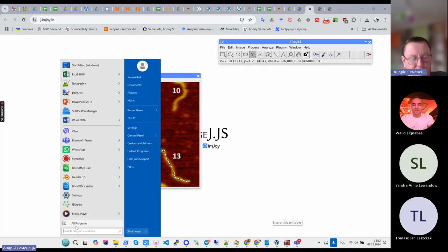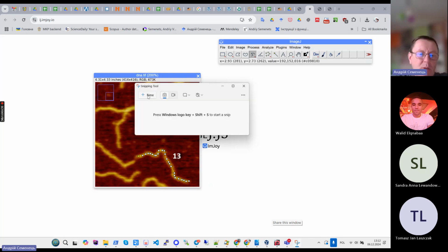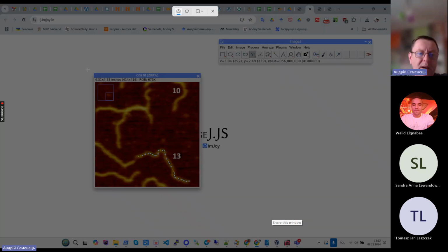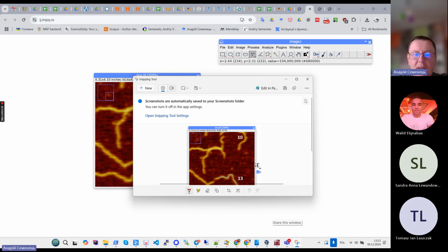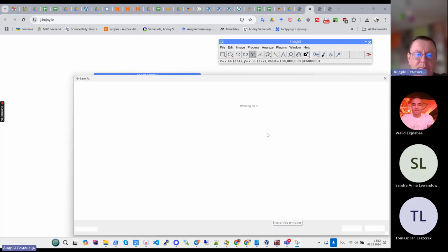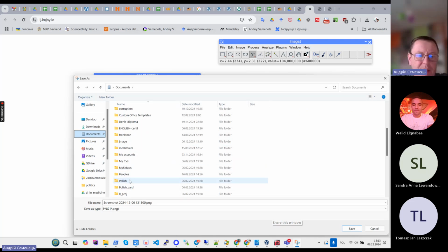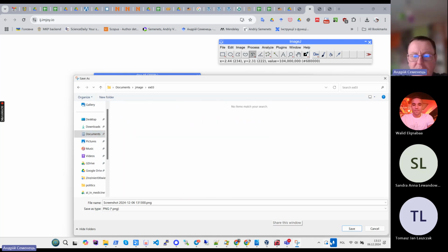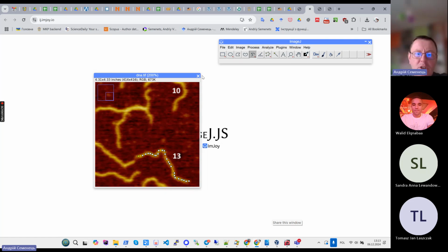No problem, those are all applicable. Or if you use another device, use the tool from there, and so on. So here is the only correct way to save these pictures. Exercise 1, let's say. Measures required, so I showed only part of this task.